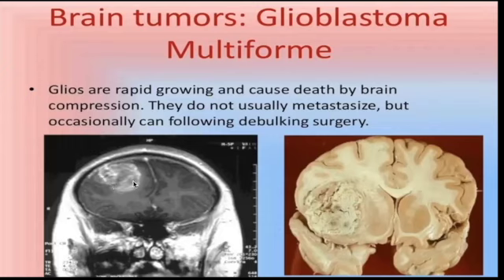If you're using a CT, I can't see it here quite clearly, but it should be surrounded by vasogenic edema on a CT. Now remember, this is a mass. So if I want to make sure that I'm looking at a mass, I should look at the midline. Now this midline is clearly shifted. Okay, this midline is clearly shifted. So that's making us indicate that this is a mass.